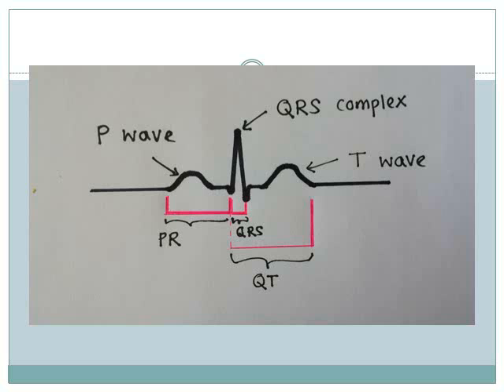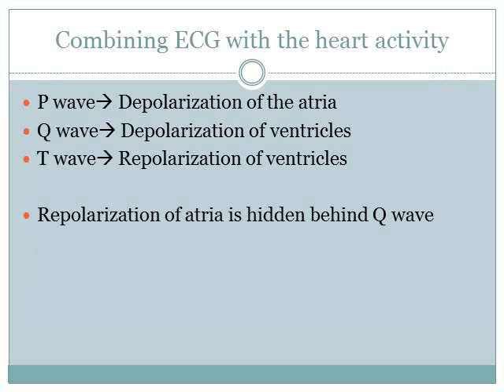this T wave. So we need to know these waves and the complexes and the durations in order to properly interpret an ECG strip. So there are specific times for these intervals. We'll go through that in a minute.